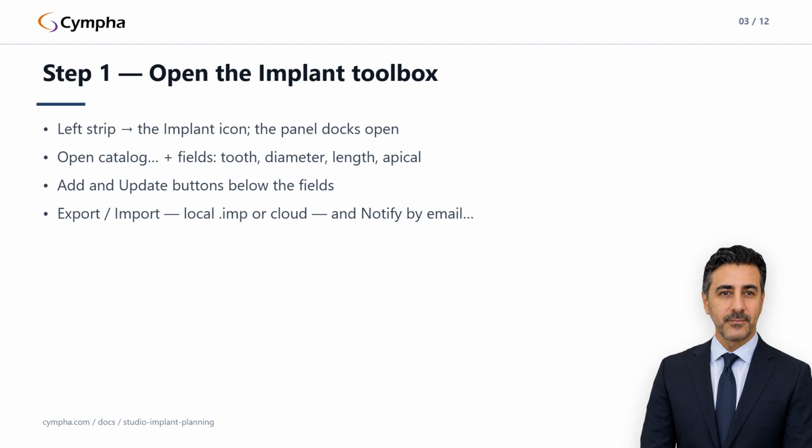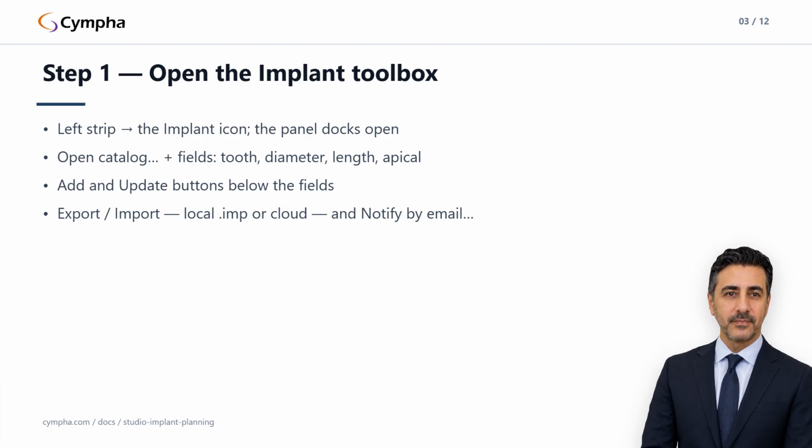Add creates a new implant. Update regenerates the one you're editing. Below those, export and import, each in 2 flavors. Local, which works with an implant plan file on disk, and cloud, which saves to your Cympha cloud. And finally, notify by email for sending a pre-filled note to a colleague.